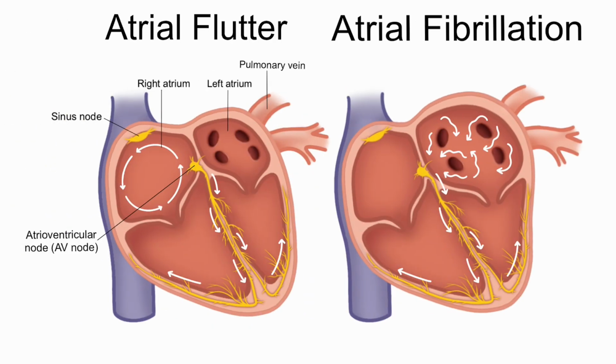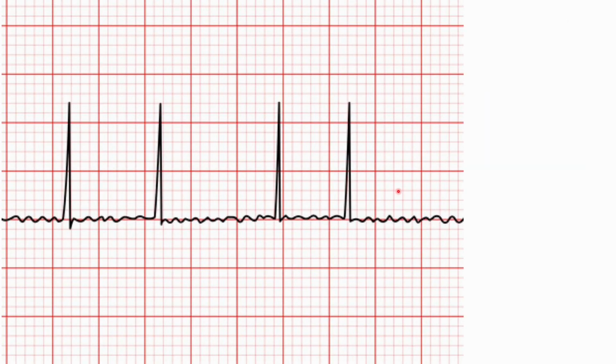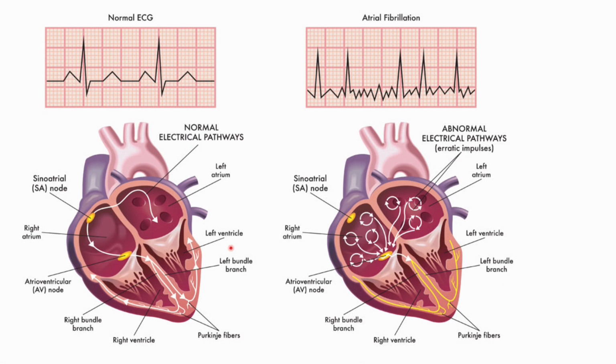The first thing you should look at in the EKG is rhythm. Now, the rhythm could be atrial or ventricular. If it's atrial, one focus could cause an atrial flutter, or multiple foci around the pulmonary veins cause atrial fibrillation. In either case, guys, a QRS will not be preceded by a P wave. This is what flutter looks like, and this is what fibrillation looks like. In either case, it's not the SA node that's pacing the heart. It's another focus above the ventricle, supraventricular.